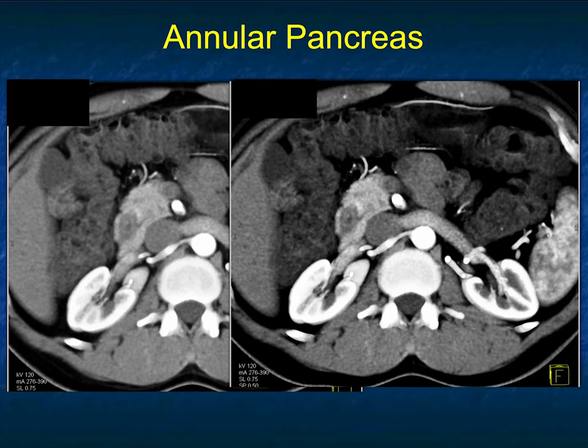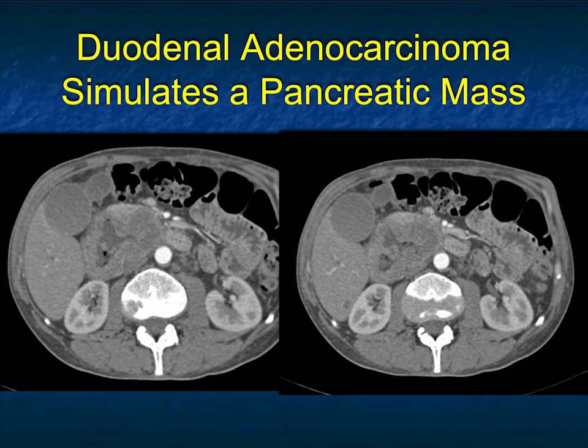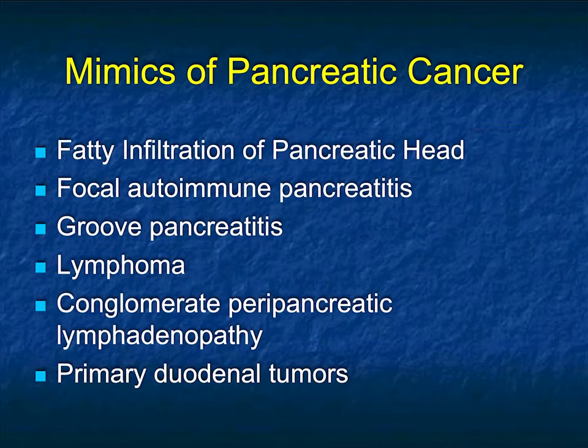Here's another set of images of that. You can see how the pancreas goes around the duodenum, surrounded, and annular pancreases can become symptomatic because the patients can have abdominal pain. So a nice example. Now, of course, when we mention duodenum, annular pancreas, we talk about duodenal primary tumors, such as a duodenal adenocarcinoma. Here's a large ulcerating mass, which could simulate a pancreatic adenocarcinoma directly invading the duodenum. One thing often helpful with duodenal tumors, you typically do not have common duct or pancreatic duct dilatation.